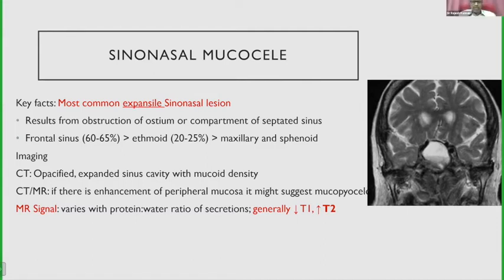The mucocele also can show compressed parenchyma. The important thing is that the mucocele is like a cyst with clear fluid, so it will appear more or less very homogeneous, whereas the fungal mass won't be so homogeneous, because it is solid.